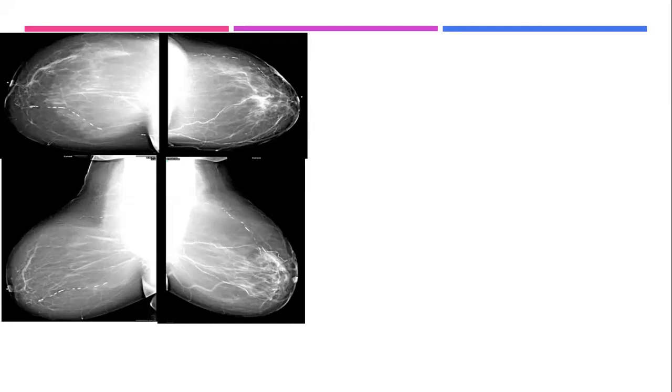Which clock? I think it is 6 o'clock. It is lower. 12 o'clock. It is at 12 o'clock. There is focal asymmetry. Yes.